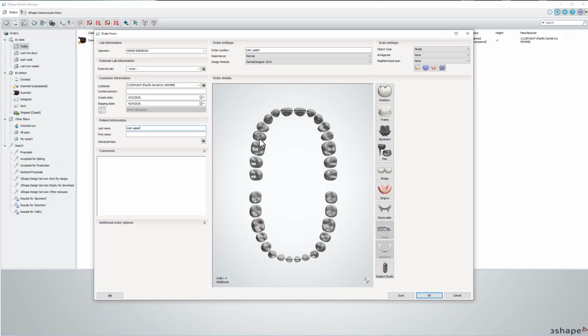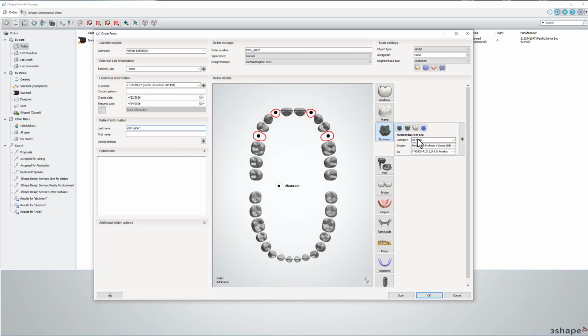So we're going to make an Icam order upper. We're going to create a very, very simple order: 4, 7, 10, 13. Those are the indications indicated in Icam at scanning. And you saw that when I loaded it up, it showed you that these are the implants. They must be the same implants. We're going to come here, DES, multi-unit direct, and regular multi-unit. That's it.